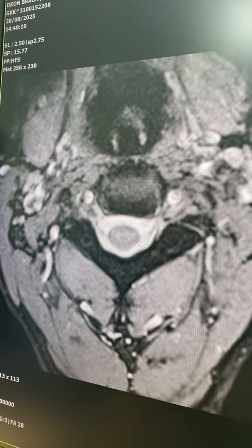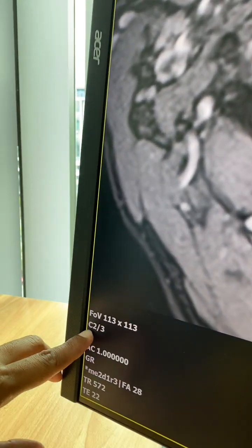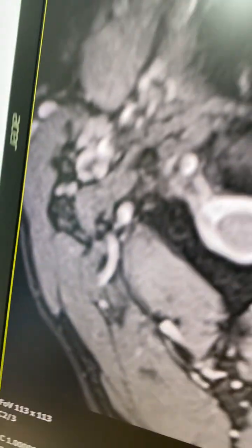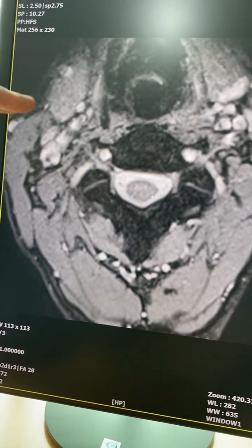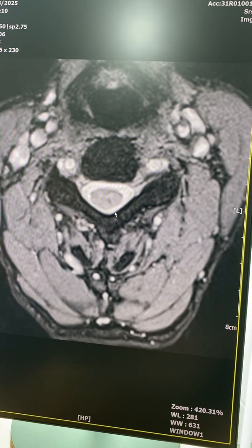And at the same time, you should... Are you able to get this? This will indicate the level. No, you just put it from far. Okay, got it. This is it. So as I scroll down, you should be able to see where we are.